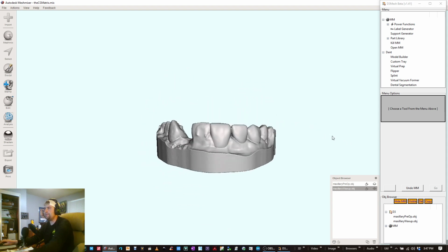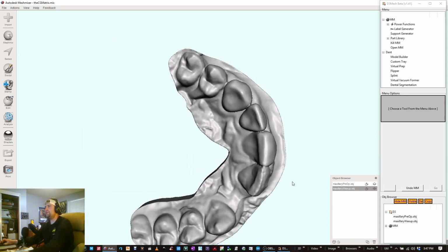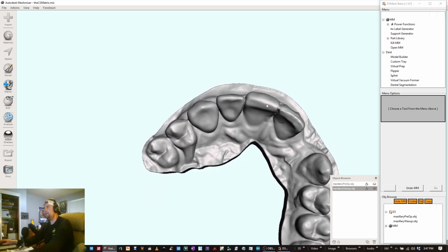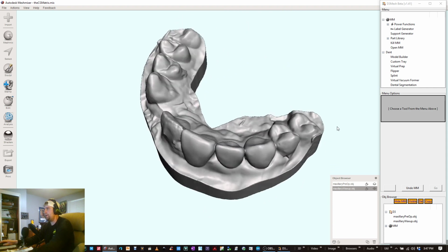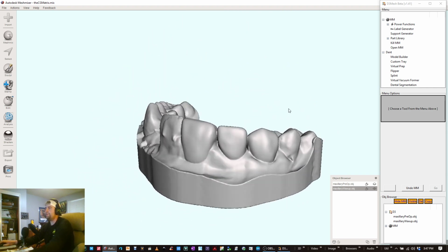I think these are the library teeth. And at least on the incisor, it wasn't just a matter of popping teeth in here and making them in the right orientation and alignment, which could arguably not be correct to some orthodontists, but this looks good, and I think it's going to be fine for him.